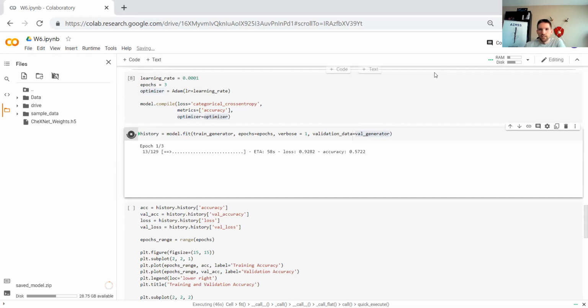And as you can see, this takes a whole lot longer than previous workshops. When you're working with image data, you might want to set this up to run overnight and then go to sleep and then see how it looks in the morning. Or if you have access to.